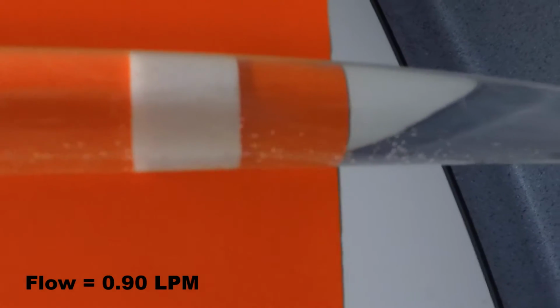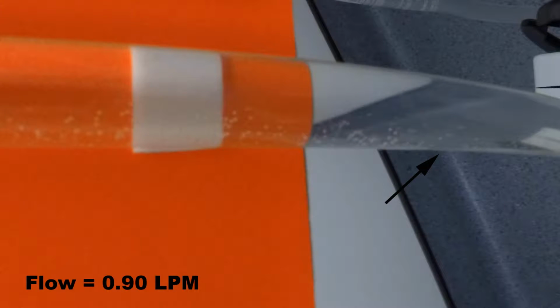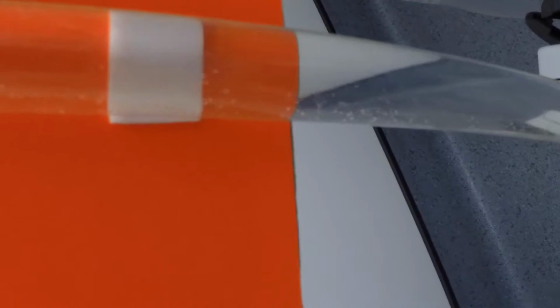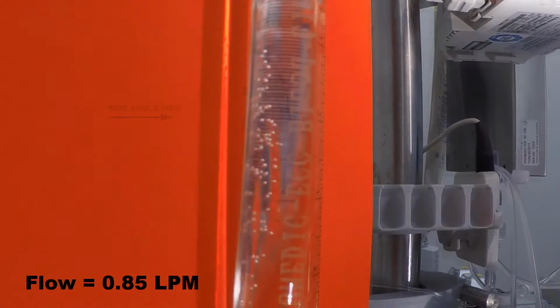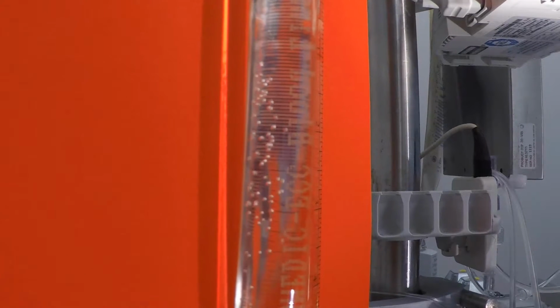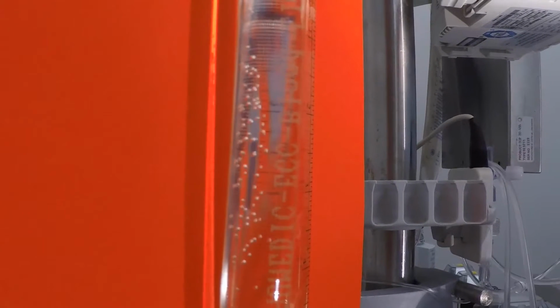This point might be better demonstrated in the next clip, which shows a group of small bubbles at low flow as they drop out of the higher velocity flow at the center of the tubing in a looping pattern towards the camera lens, before rising up again along the tubing wall. Next, we see another side view of a cluster containing smaller bubbles that appear to be recirculating. The arrows indicate bubbles located centrally in the tubing and moving downward, while bubbles along the inner wall are moving upward. At low flow rates, tubing connections, bends, curves, and long tubing sections allow eddies or countercurrents to be established in the low rate of flow.